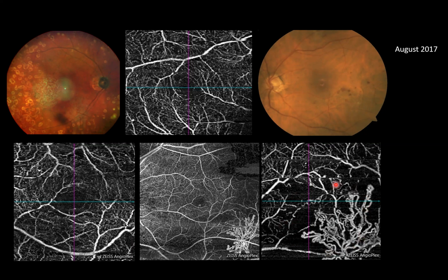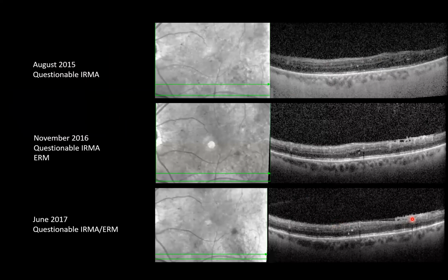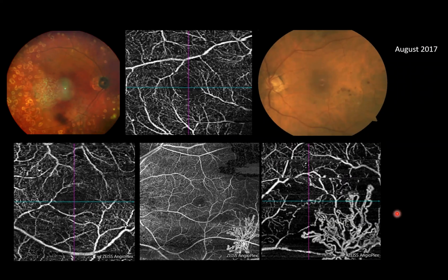When you do the OCTA in the left eye, in the area that was in question, you can see that there is a huge area of neovascularization. This frond is very obvious on OCTA. It was nowhere near as obvious on the previous images on the OCT, but in the OCTA, you can see it very well. And now that you appreciate where it is, you can also see it on the color image. So the OCTA helped you to decipher where the new vessels are without the use of fluorescein.